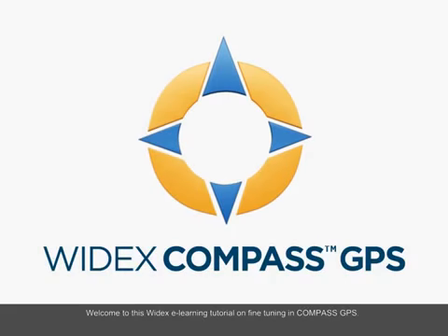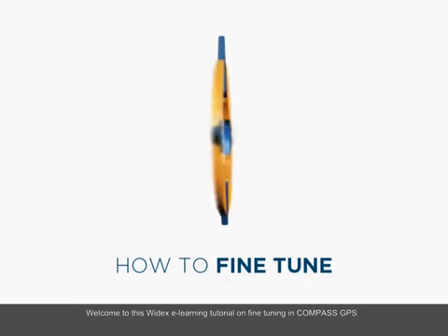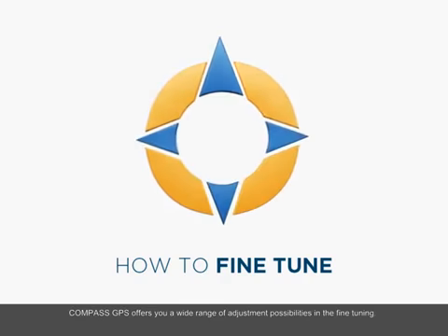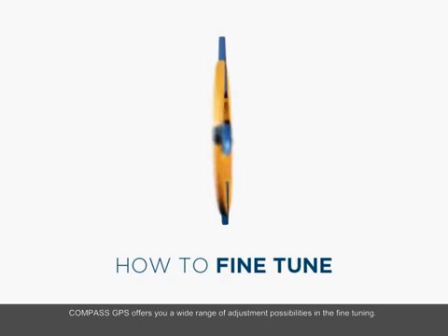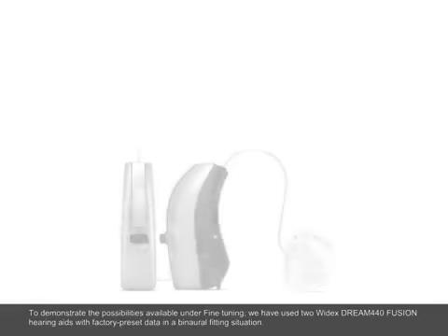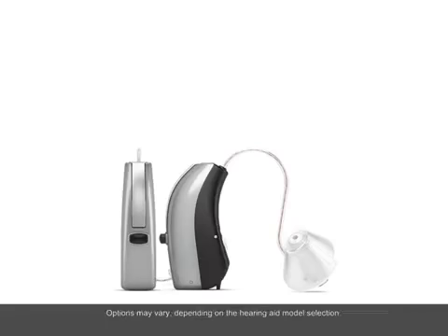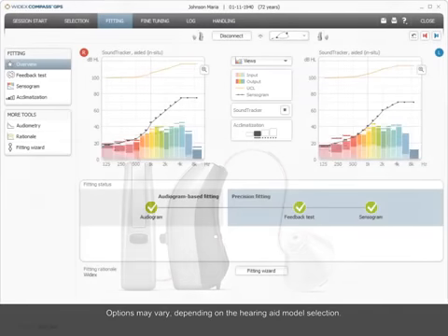Welcome to this Widex e-learning tutorial on fine-tuning in Compass GPS. Compass GPS offers you a wide range of adjustment possibilities in the fine-tuning. To demonstrate the possibilities available under fine-tuning, we have used two Widex Dream 440 Fusion hearing aids with factory preset data in a binaural fitting situation. Options may vary depending on the hearing aid model selection.